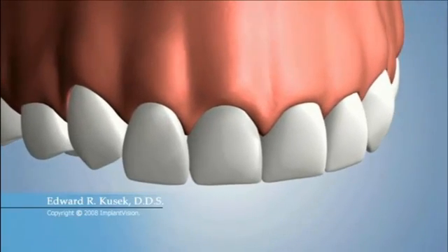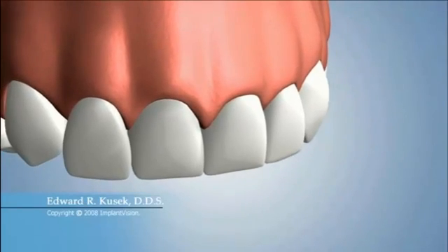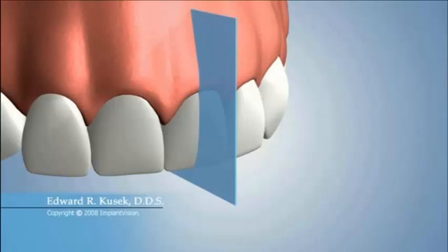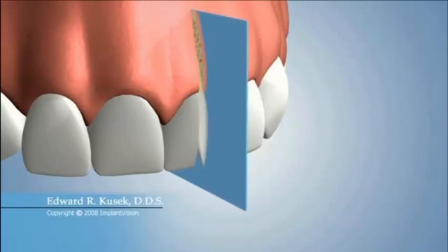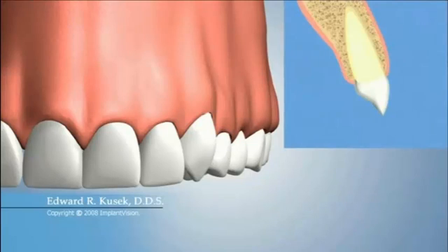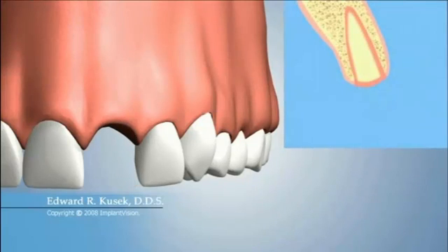All our teeth are held securely in the jawbone. Disease, decay, or trauma may lead to tooth loss.